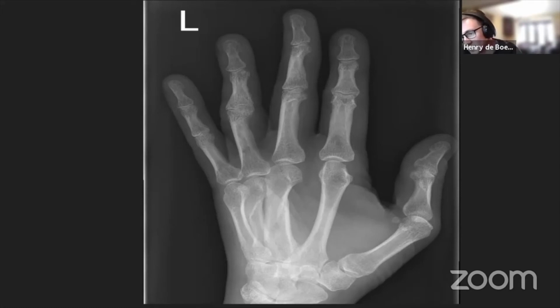Is there a reason for the association? What I was saying was that in order for your lunate to dislocate, you have to injure the scapholunate ligament. The lunate and the scaphoid are usually held together by a ligament, and if you disrupt that ligament, you can then dislocate your lunate.